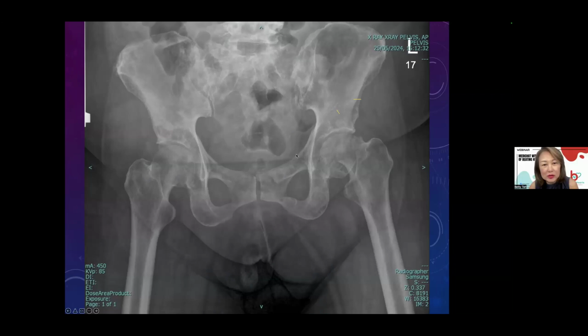Okay, so what about this? This is multiple lytic lesions, bony lytic lesions. Some more. Nice. Guys, come give me the answer, faster. Everyone must get the correct answer for this case. Okay, alert 4. What came in for alert four?